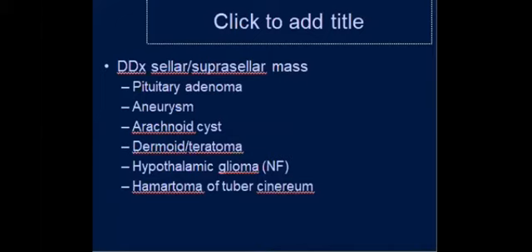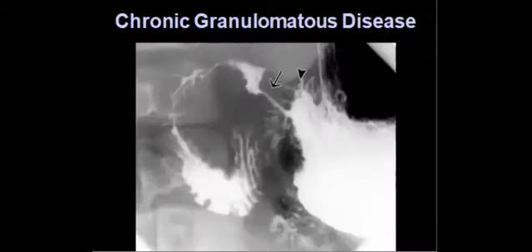Let's shift to this one. Yeah, we mentioned it already, so I will just skip it. Yes. Okay, so this one is much easier. Maybe I can show you this appearance first. So what is the abnormality here?